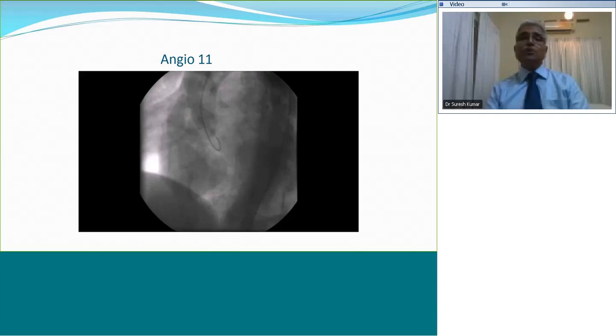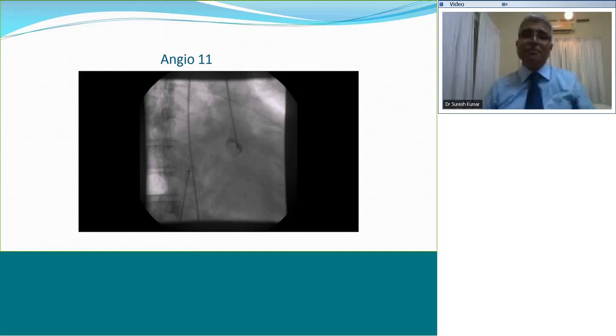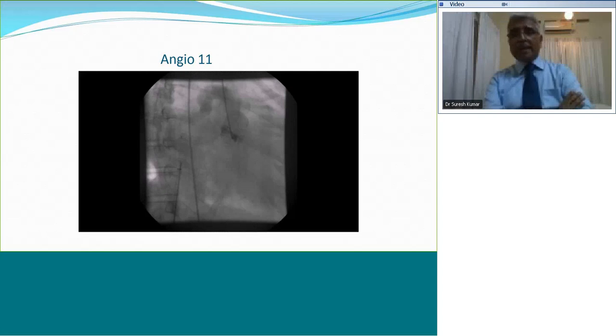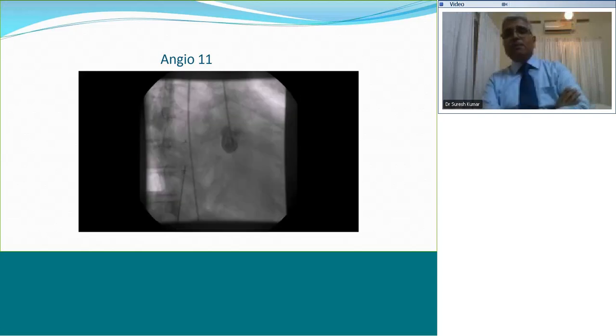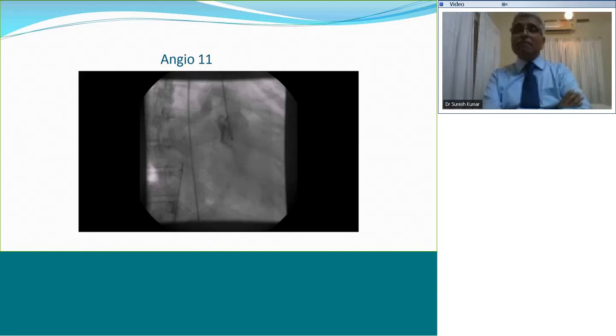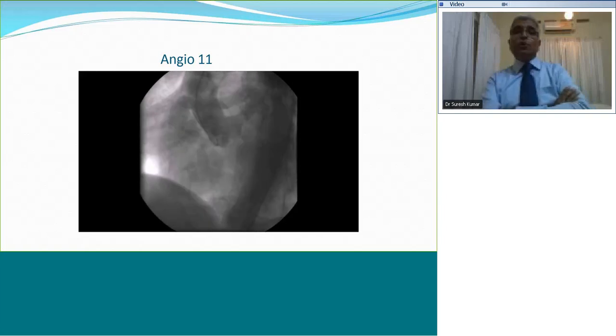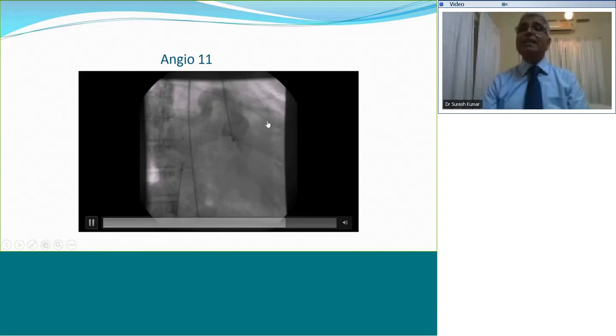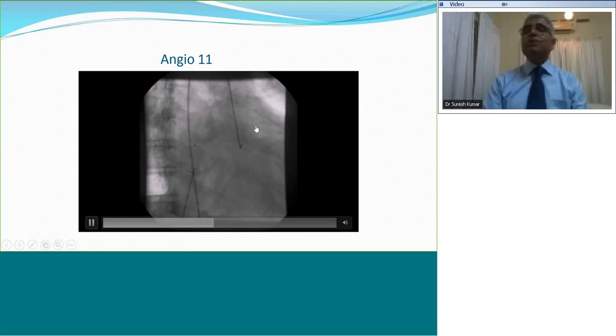Coronary arteriovenous fistula from the left main coronary artery. Okay, actually I meant coronary cameral fistula. Remember, CCF will also be called congestive cardiac failure, which this lady is in. You're right. Your only problem is partly because the image is perhaps not as clearly visible to you as I would like. It's a fistula from the left sinus to the right atrium or to the high right atrium SVC-RA junction. You can actually see the left coronary artery distinctly from there, and this is a left sinus to RA fistula.